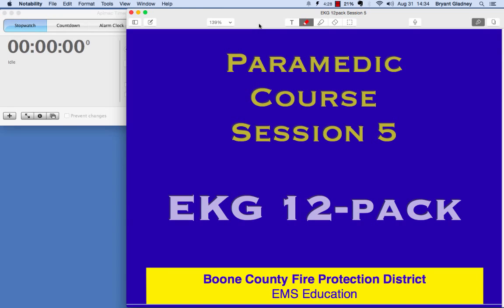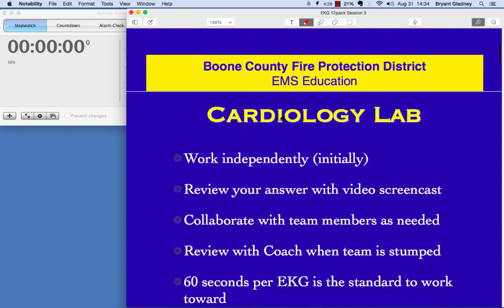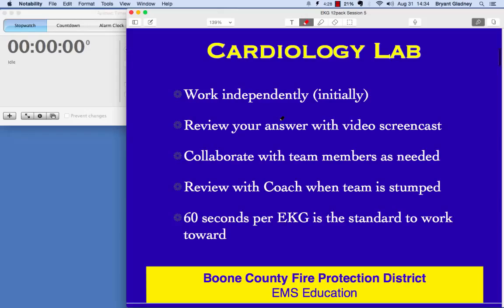Okay, here's an EKG 12-pack for session 5 of the paramedic course. This is a cardiology lab session. We're going to work independently to start with, and then review your answer with this video screencast. Then collaborate with team members as needed to check your work and get any feedback from them, and if you're totally stumped, then you get a coach involved.